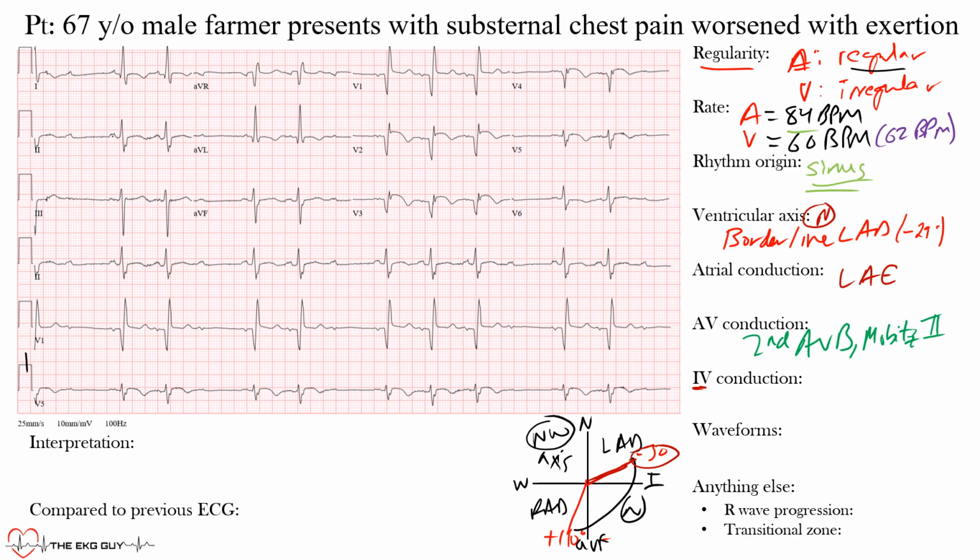So here the machine gave us, since it's hard to make it out on your own, a QRS duration of 128 milliseconds. So we would call that intraventricular conduction delay, meaning there's delay in the conduction within the ventricles, and that can be from a bundle branch block that we may see here or some other things. So let's get moving on because there's still a lot to cover here. So we have some prolongation of the intraventricular conduction.